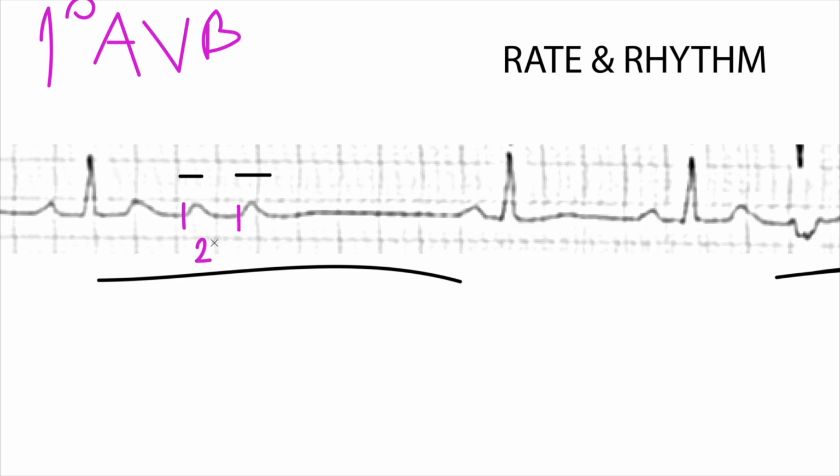So this rate here is 250. Okay, roughly. Now, one thing that does correspond to this rate is atrial flutter. Okay, so we do have what appeared to be flutter waves.